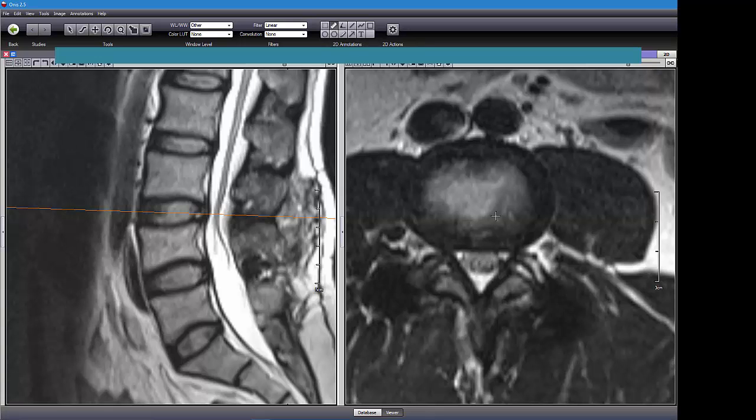And if I get my little handy dandy measuring tool out here, let's measure it again. It should not be under 10, right? 10 millimeters. Anything under 10 is stenosis, central stenosis. It's 7.06 this time. So definitely got central stenosis.